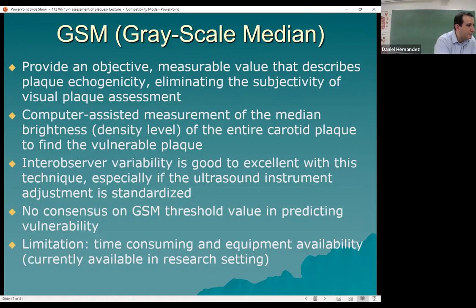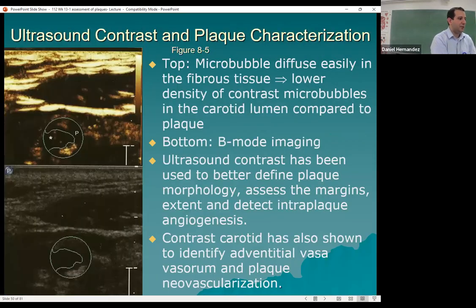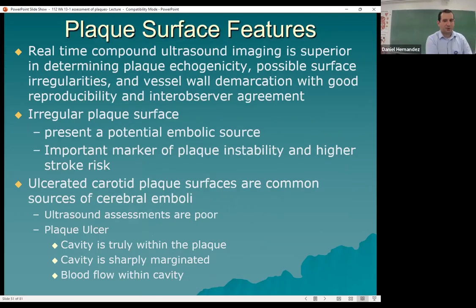Slides. So basically for us, when you guys are at Christiana, they're gonna want you to describe extent and severity, what segments of that vessel are involved, how severe is it? So usually they say greater than 50%, less than 50% for severity. Maybe if you want, you can ask them if you want to describe it as greater than 75%, or I'm sorry, greater than 70%.